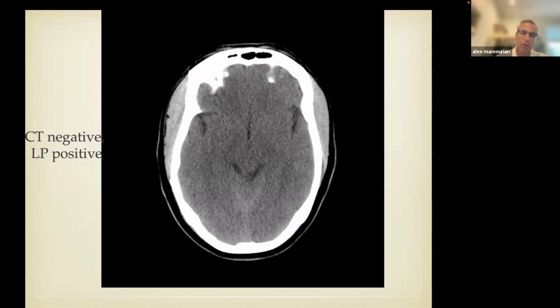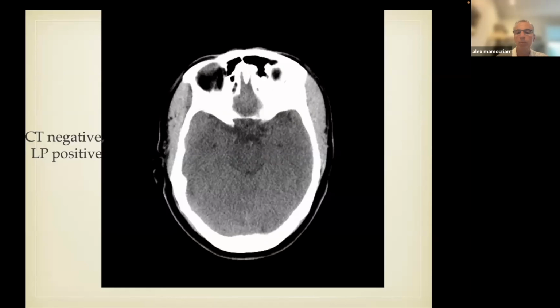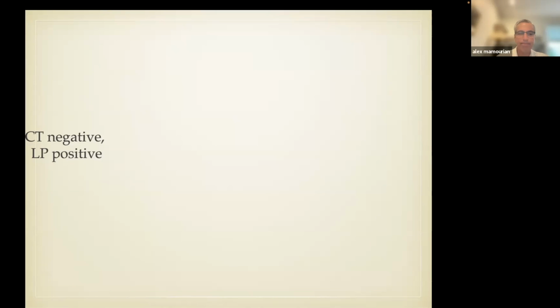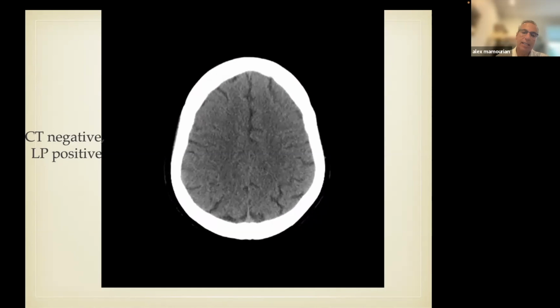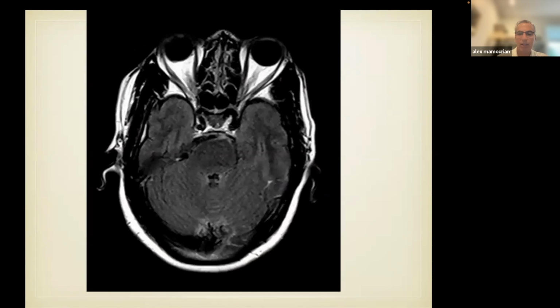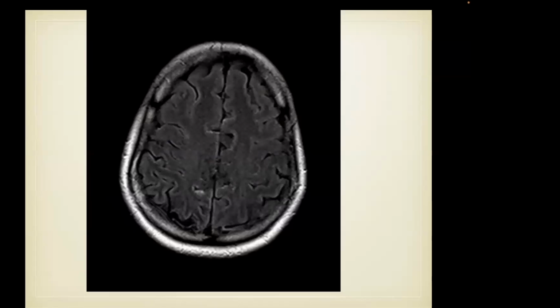But you're absolutely right, Viken. This is a difficult call, but probably abnormal along the tentorium there. And again, that comes back to my point about why I think CT is so difficult to read, because of these subtleties of detection. And MR is more, things are more conspicuous.